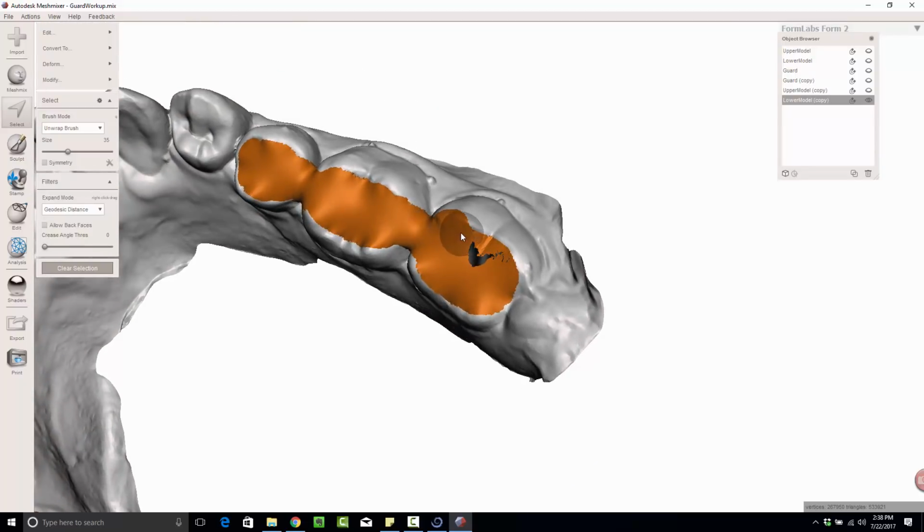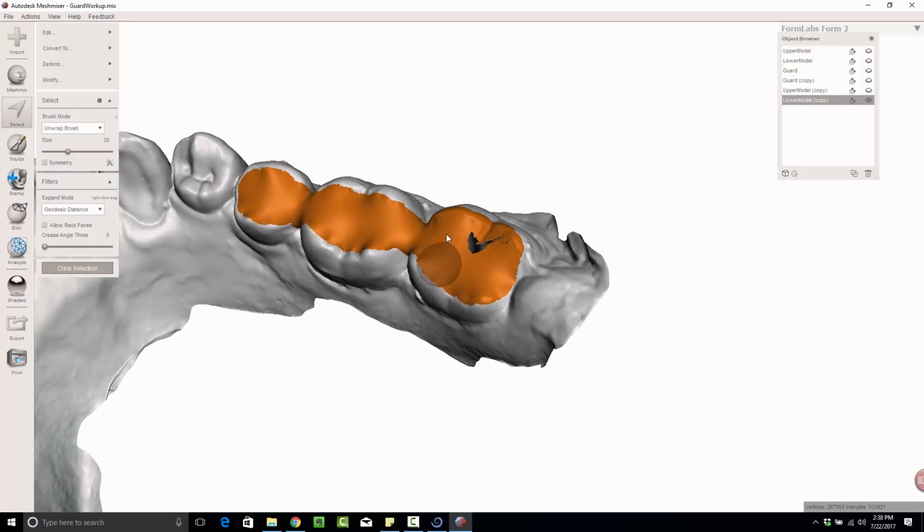Couple little click marks. Again, don't worry about that gray bleb. I'm going to hit Control Z because I got a little bit overzealous with that click. Control Z is the same thing as undo. If you're not familiar with that shortcut, I would hope that you could remember that, because that's going to work for just about any Windows-based software.